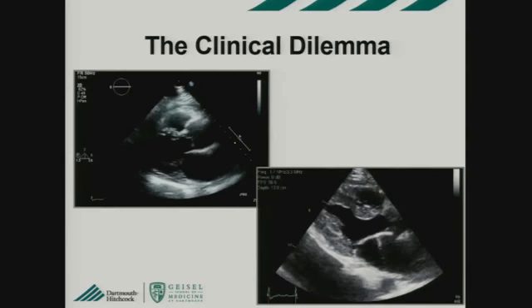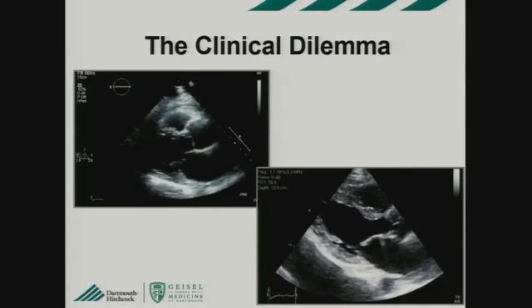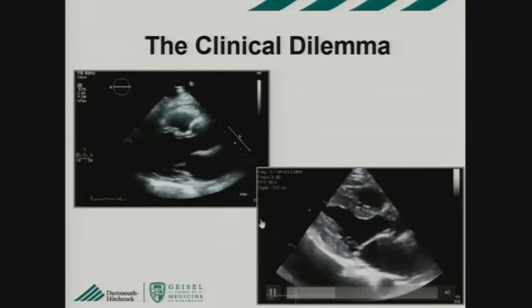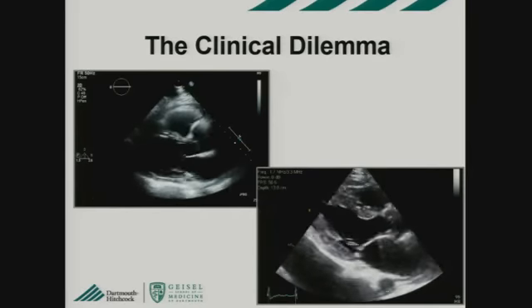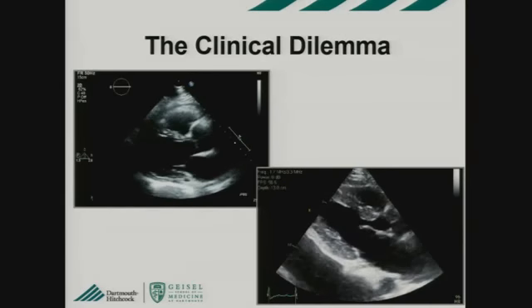So are we done? Are they both types of heart failure with preserved ejection fraction? Do we simply give a diuretic and control the blood pressure and heart rate? Well, no. The patient on the left actually has constrictive pericarditis, and the patient on the right has restrictive cardiomyopathy. We can pick this up by echo, but it often takes a little more looking at the standard echo and possibly adding some components to turn your echo into a constriction protocol echo to really nail the diagnosis.